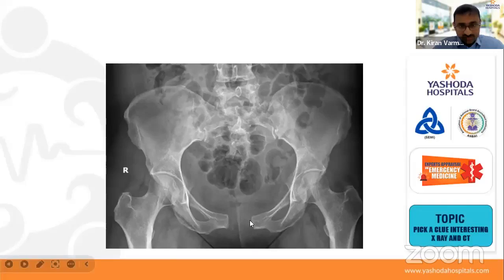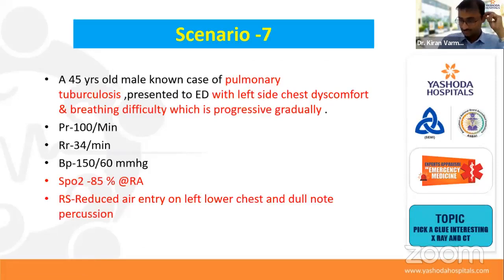Now you can see the different distance here. Then you can see the fracture over here, L of sacrum. So this is an open book fracture, which might be leading to hemorrhagic shock. Usha, pelvic diastasis. You're right. So the majority of the people are answering correctly.